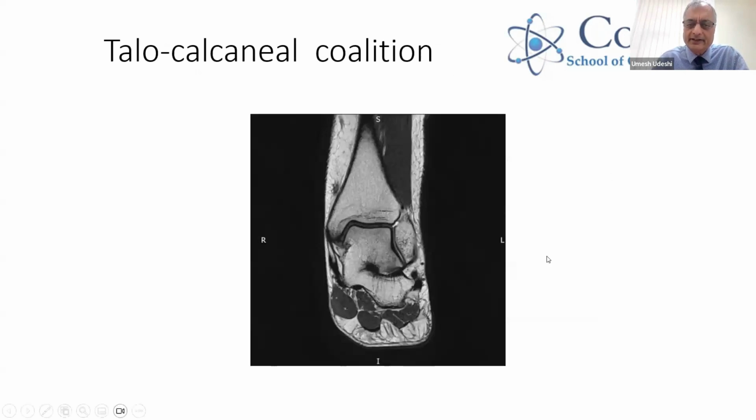You may see other bony abnormalities such as coalitions, and there's all sorts of complex coalitions you get in the hindfoot. But this one is shown pretty beautifully. There's a complete coalition of the talus. Well, there's a beautiful bony coalition of the talus and the calcaneum here on the medial side. Sometimes it's a fibrous coalition, so you can still see that they're separate bones, but there's fibrous tissue sort of fusing them together. And in that sort of condition, they may have symptoms, and you may see marrow edema on both of these, bony or fibrous, showing you where the stress reactions are because of abnormal mechanics.